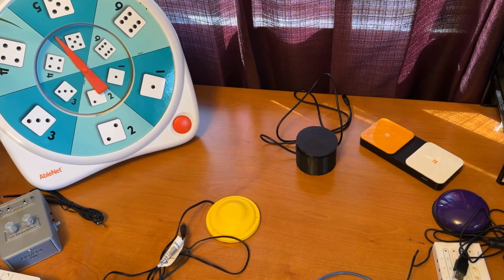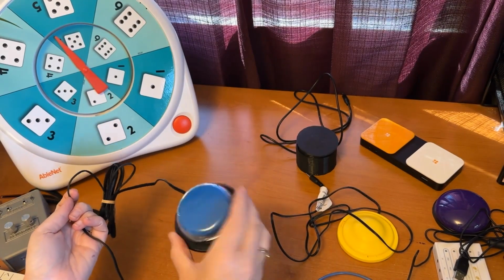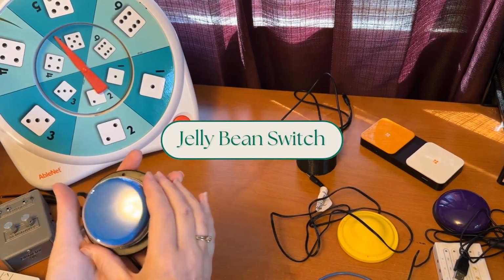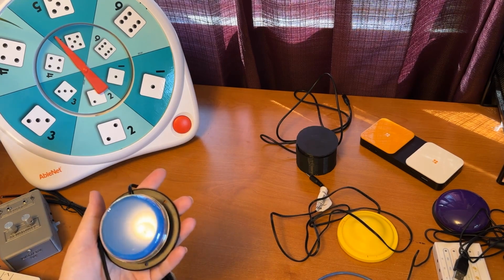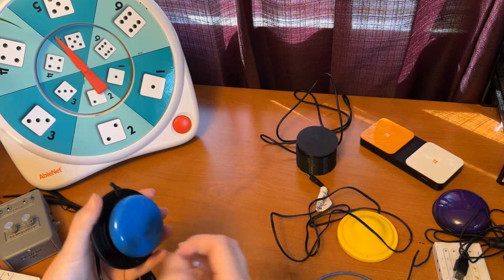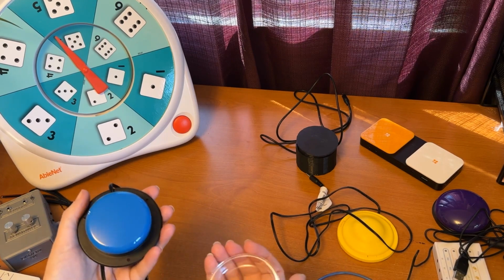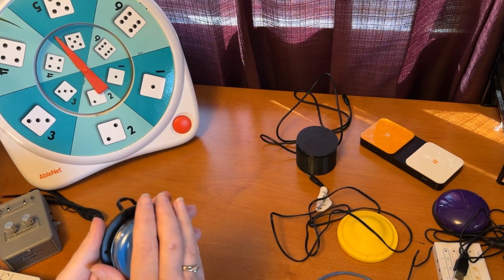So here I have a variety of different types of switches. Earlier, we had talked about the jelly bean switch, which is just kind of a round, small switch. Again, it has some things on the back so that it can be mounted. When you press it, it activates. A lot of these come with a cover that comes off, and the color on top is interchangeable, which means you can do different colors for different types of tasks.